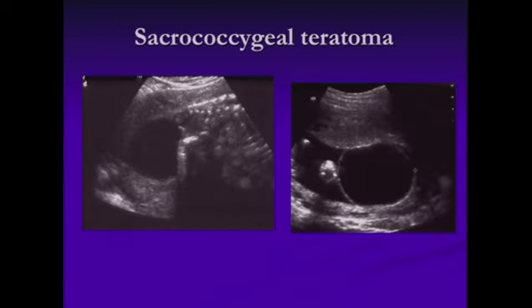Well, the next topic after amniotic band syndrome is sacrococcygeal teratoma. Of course, we want to differentiate a sacrococcygeal teratoma from a neural tube defect. And the big difference is that when you look at the spine, posterior elements are normal. Sometimes if a sacrococcygeal teratoma is large enough, it will actually push up against the vertebral bodies and make the anterior portion of the spine be deformed.